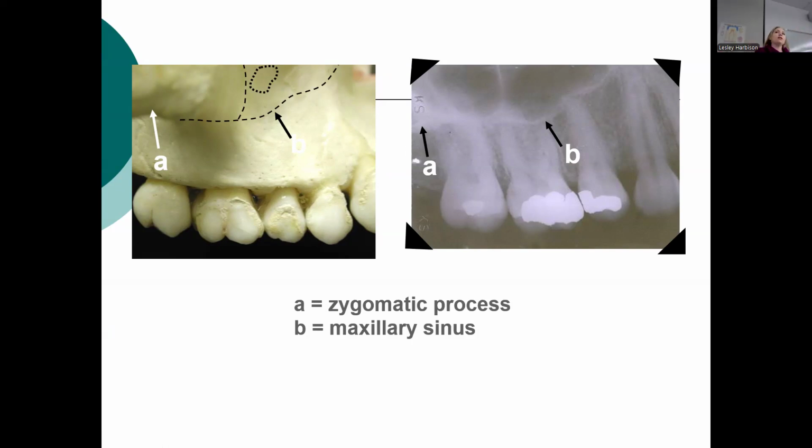So every time you're looking at different PAs, sometimes you're just picking up a little piece of something. Sometimes you see the whole thing really, really well. It just depends. What is that little line in between? Oh, this one, it's probably a septum. So there are divisions of the sinuses. There's lots of sinuses and they have little divisions. On some of your resources, it might say maxillary sinus septum or something like that, but I don't test you on the septums. They're just divisions that divide up all the different sinuses.